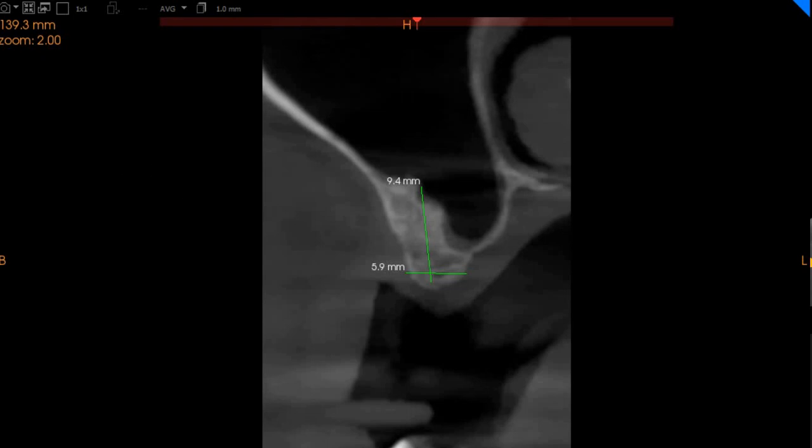We have also gone ahead and placed an implant for our doctor so that they have an understanding of what the implant parameters will look like. So we have placed a virtual implant. This is a 4.27 millimeter implant. A 4.27 millimeter implant will have some of its threads along the wall of the sinus, but if grafting, if osteodensification burrs are used, this implant will very comfortably be snuggled in this grafted region.